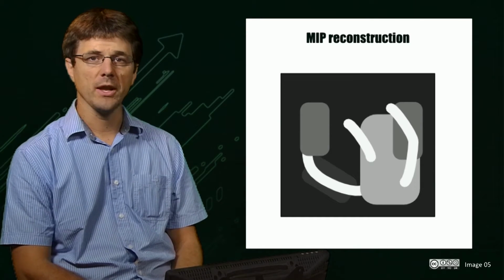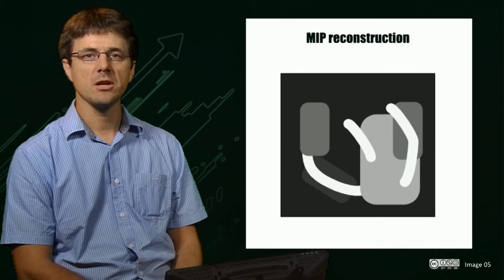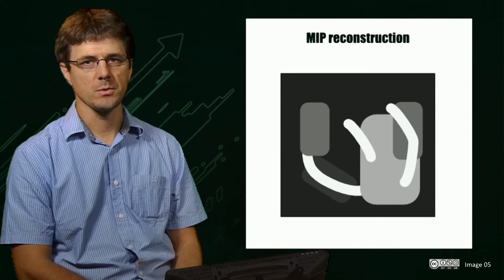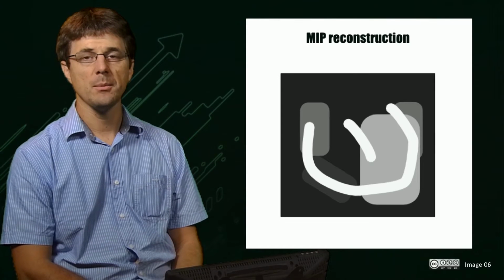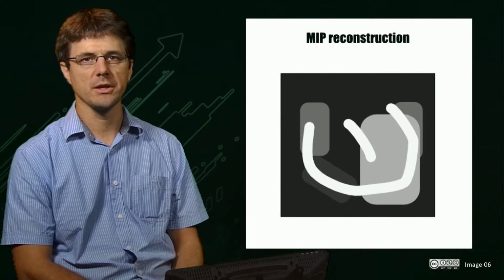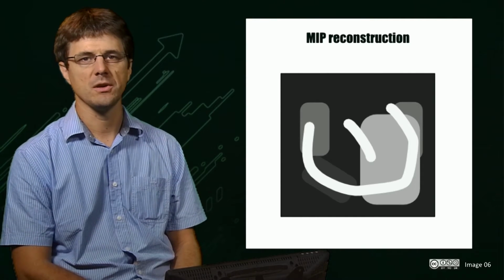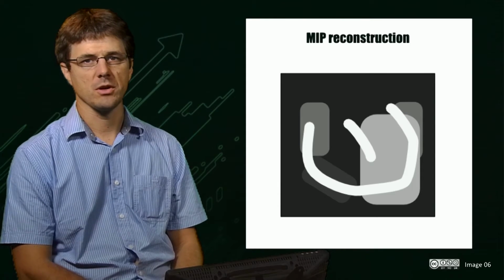If we simply overlay the 3 slices, we'll get an image similar to this. While it is close to visualizing the bony structures we want, parts of it are still obscured. In a MIP reconstruction, we project the maximum value across all 3 slices for each pixel of the image. This gives us a result that can much better visualize the bony structures.